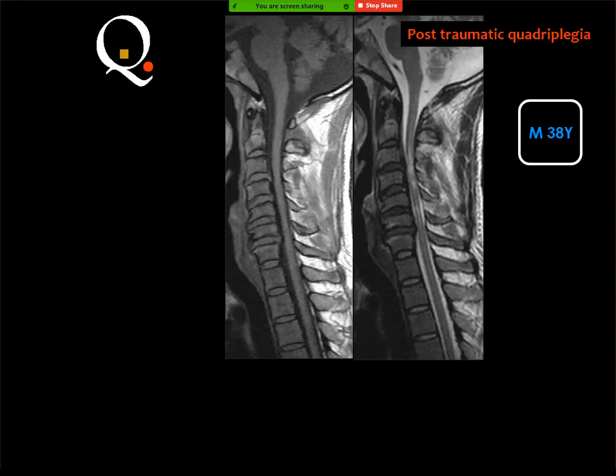And what do you think of this? Cervical MRI, T1 and T2. Yeah. Straightening. Yes. And multiple decreased vertebral heights. This is myelomalacia. Myelomalacia. Okay. Abnormal signal. Do you feel that this spinal canal is normal? No, there is herniation between the discs. Yes, but there is edema of the cord.